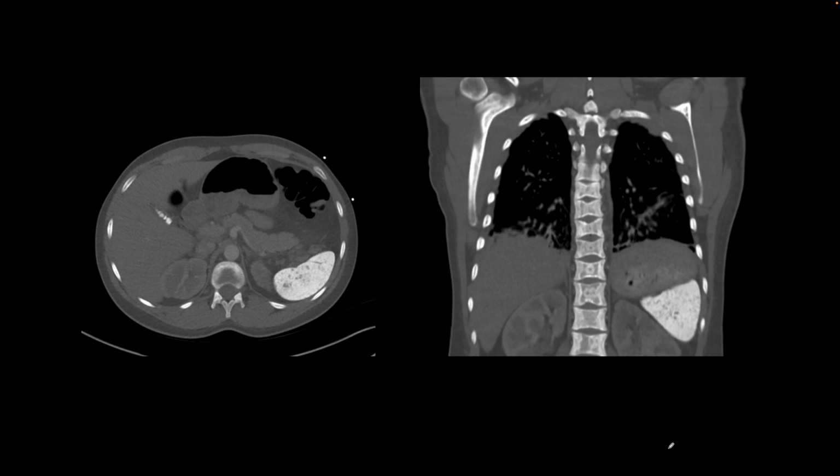Here is our next patient, and we have performed a CT of the chest, and we find several findings related to sickle cell disease. There is diffuse intense calcification in the spleen. This is also called autosplenectomy, and the vertebral bodies show characteristic fish mouth appearance from sickle cell disease, and also the trabeculae are hyperdense compared to what we see in normal patients. These patients also develop hyperdense gallstones, and that's another finding related to their sickle cell disease.